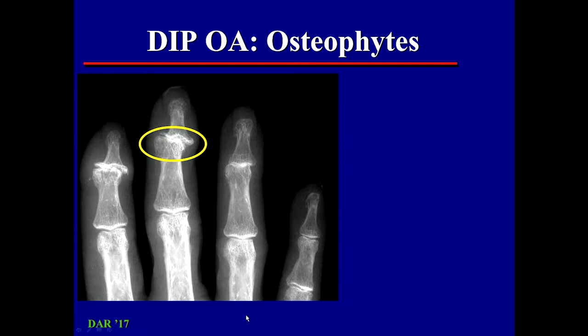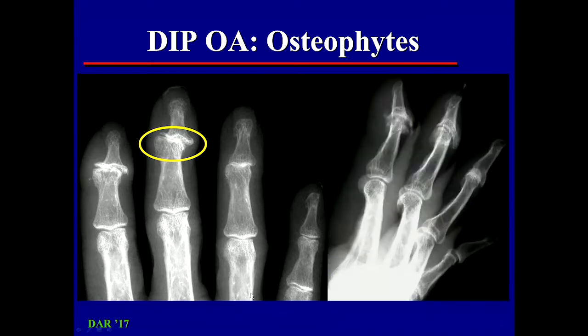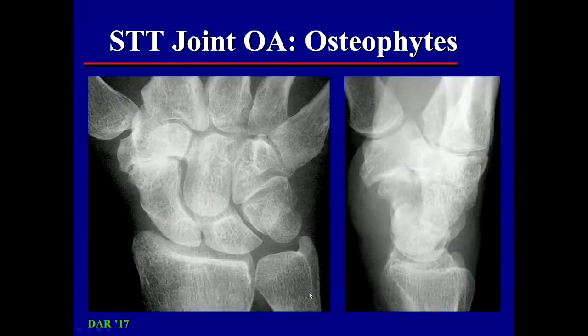They're superimposed. You're looking at them en face. On the lateral examination, you can see they're humongous osteophytes here in profile, and they're sitting right on top of the bone here on the PA examination. So when we look at the fingers and the toes, you have to use your lateral examinations to find your osteophytes.